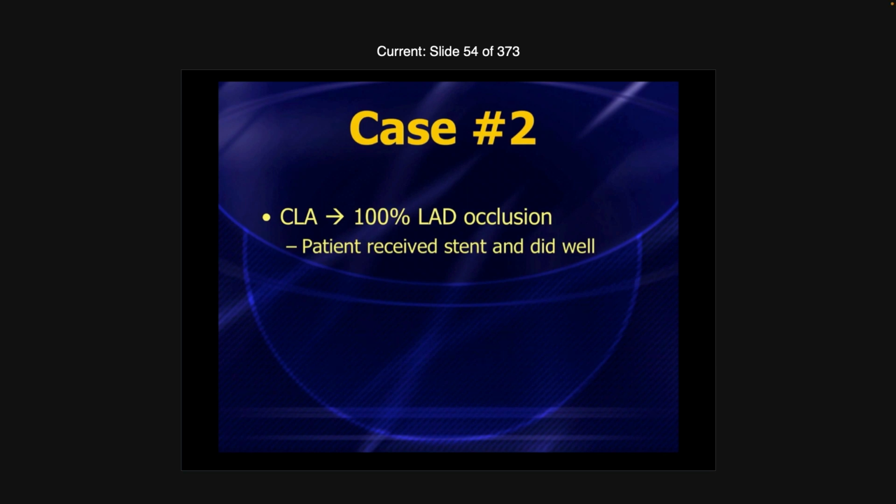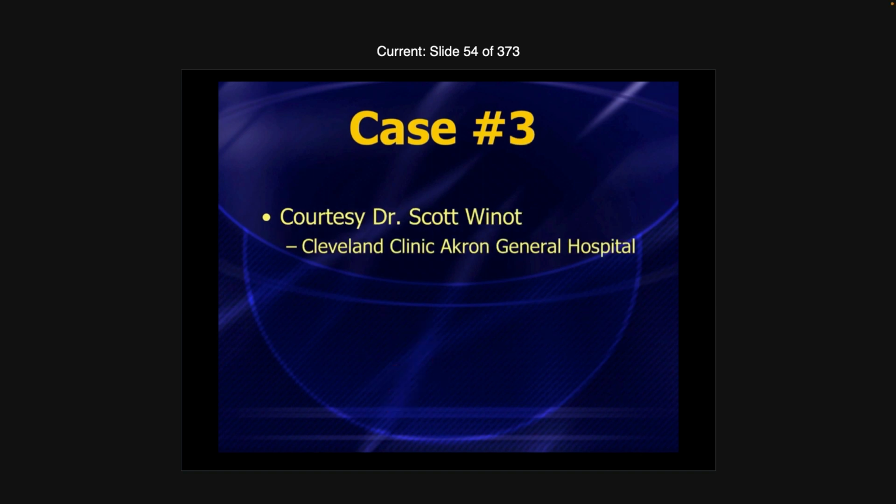This patient had that type 1, I'll just refer to it as type 1 hyperacute T-wave, where the QRS complex was maybe about that big, and the T-wave was really, really big. And if you can take the entire QRS and fit it into the T-wave, that is early ischemia until proven otherwise. They didn't even wait. They just did cath lab activation right off the bat, and that was 100% LAD occlusion. So kudos to them for saving a life.